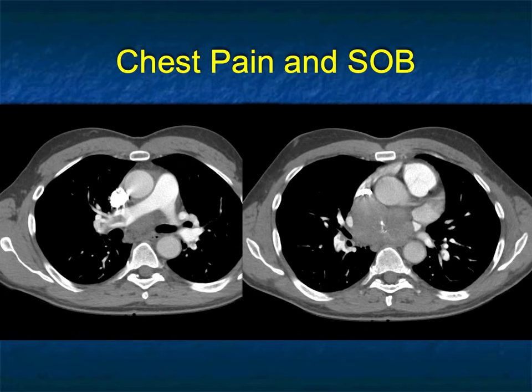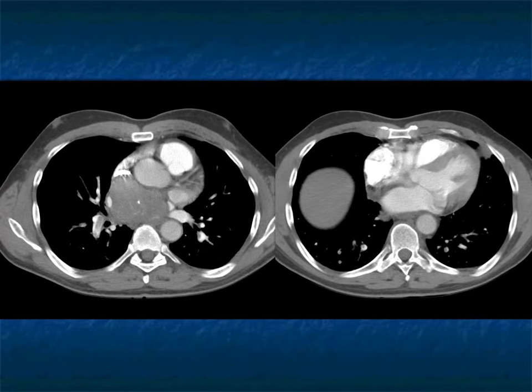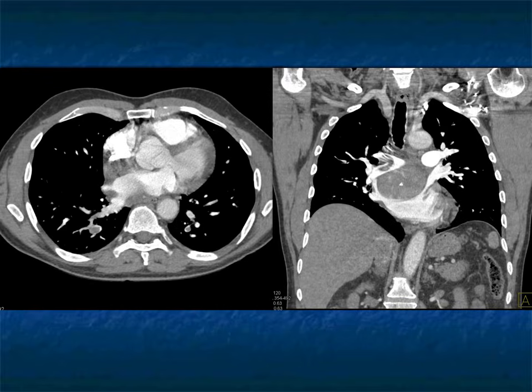Chest pain, large mediastinal mass. It's located middle to posterior mediastinum. Yes, there are PEs everywhere, particularly the right main pulmonary artery, which is why the patient presented. You can look at this case, this calcification of the mass. You could say lymphoma, metastatic lung cancer, metastatic renal cell cancer. All of those tumors can go to the mediastinum, involve anterior, middle, or posterior mediastinum. Again, lung cancer, if you had a lung mass, would be a good thing to think about.